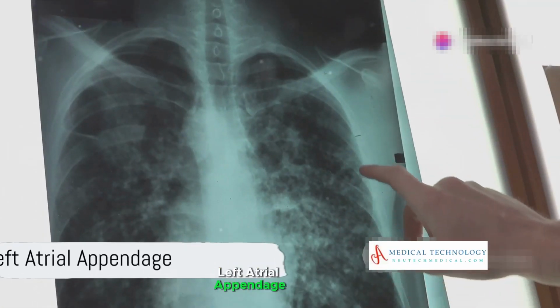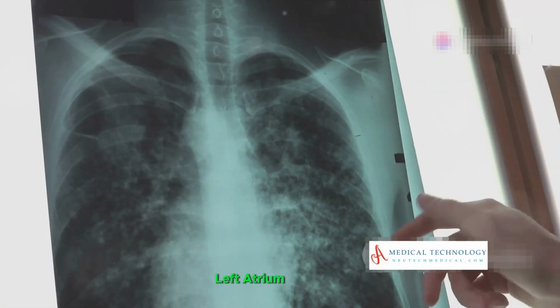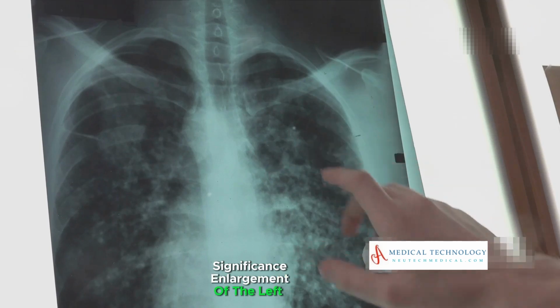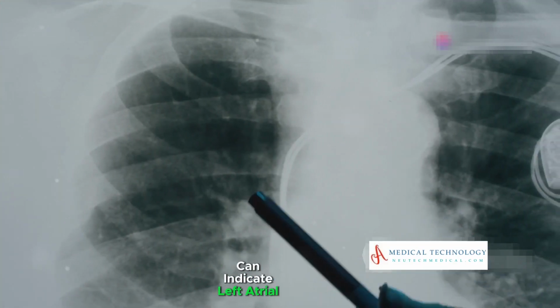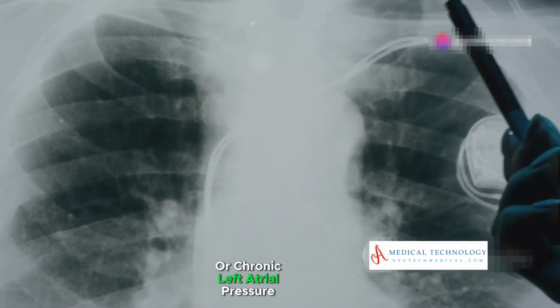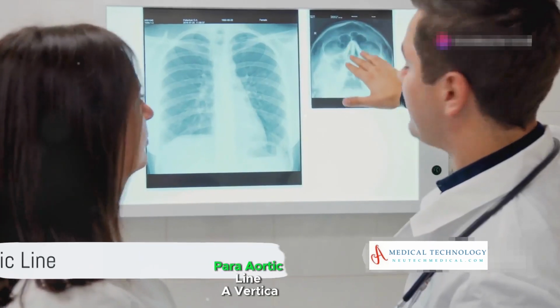Left atrial appendage. A small outpouching from the left atrium, seen below the pulmonary trunk. Significance: enlargement of the left atrial appendage can indicate left atrial enlargement, often due to mitral valve disease or chronic left atrial pressure overload.